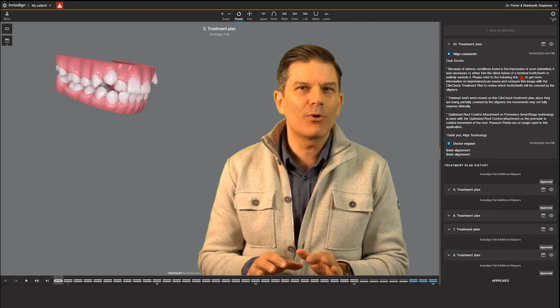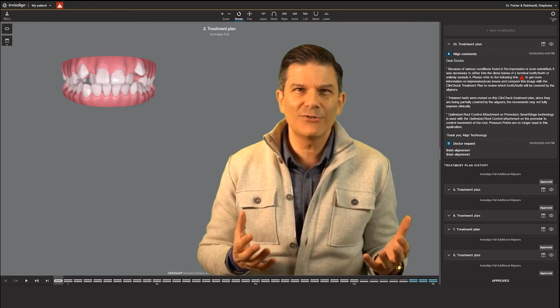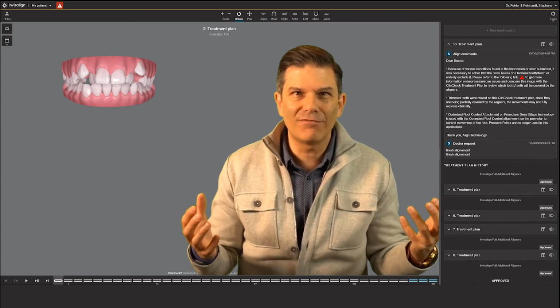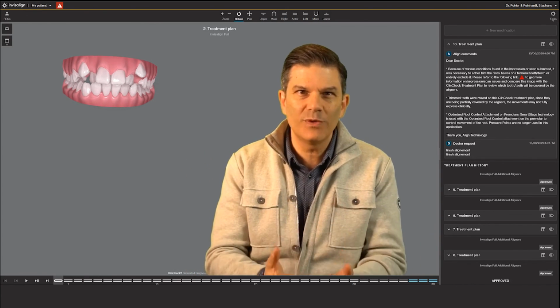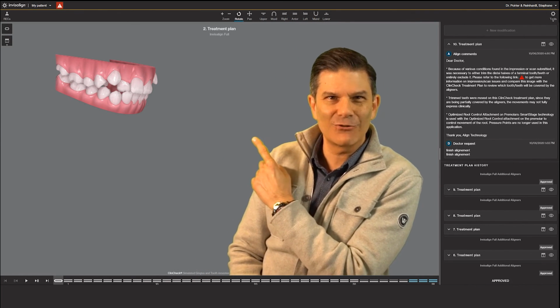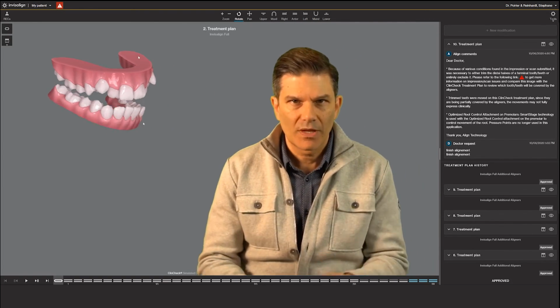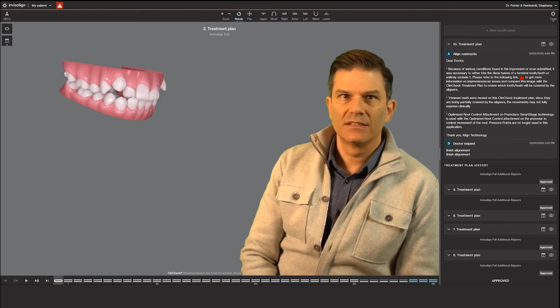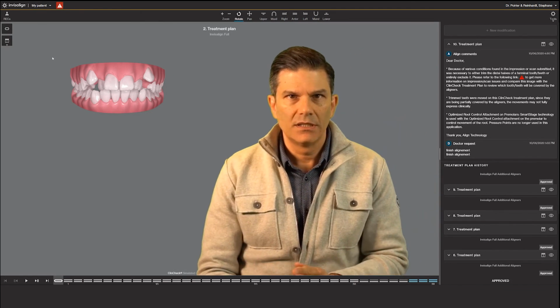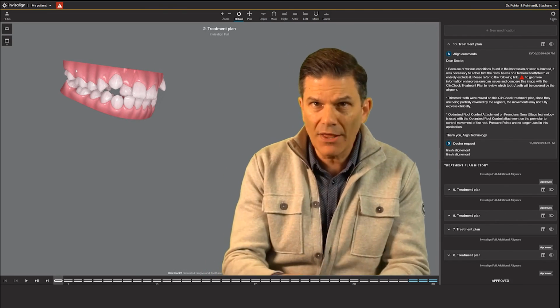I want you to remember one thing that is crucial to understand. All this here, everything you see, you have to take control of this. This is your environment. This is where you will treatment plan your cases. Don't let my friend Cece here be in control. This thing doesn't bite. You have to be in control. Down, boy. You have to be in control. That's it. And have fun and try things.